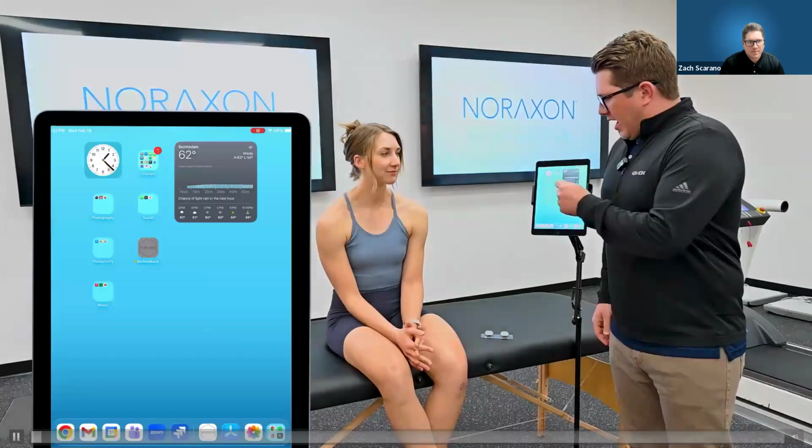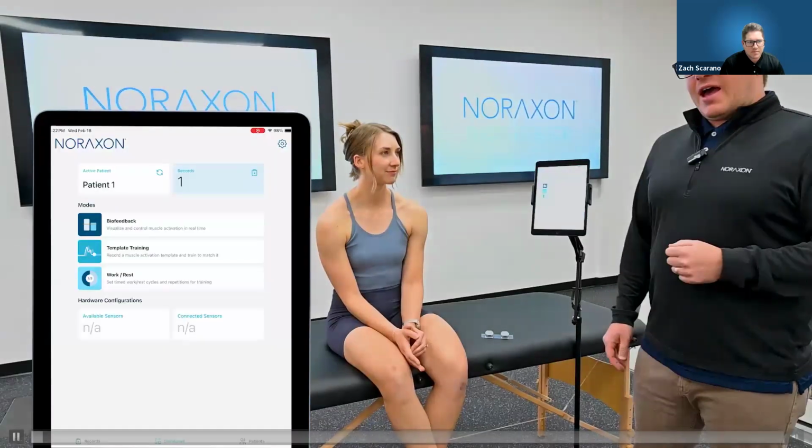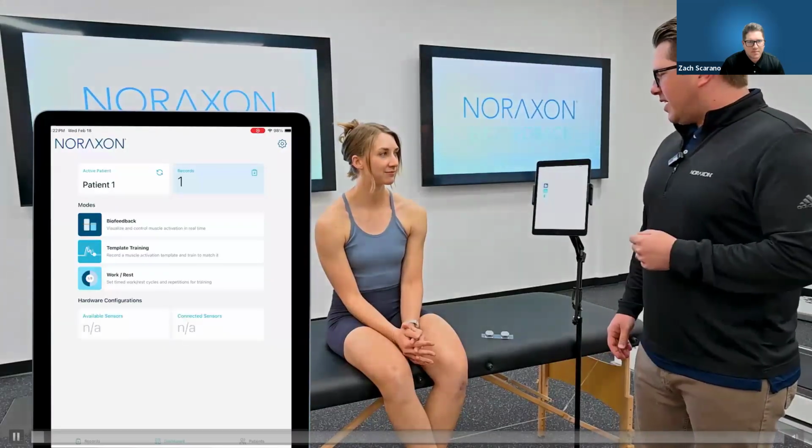Welcome to the Noraxon Biofeedback app demonstration. We're going to step through the app today and look at everything from sensor setup to the different recording modes, report options, and everything in between. After launching the app, we arrive at the dashboard.